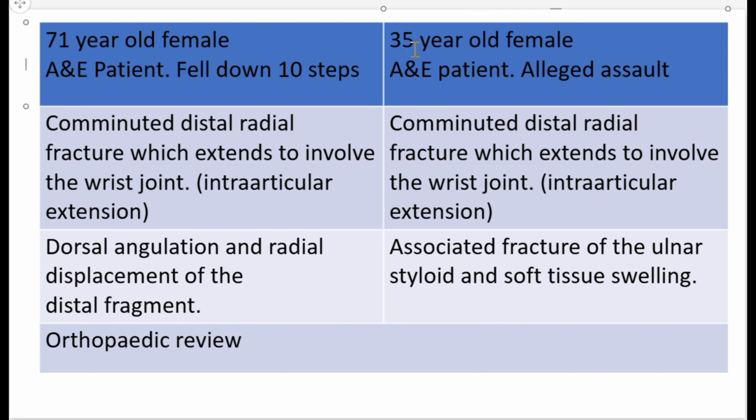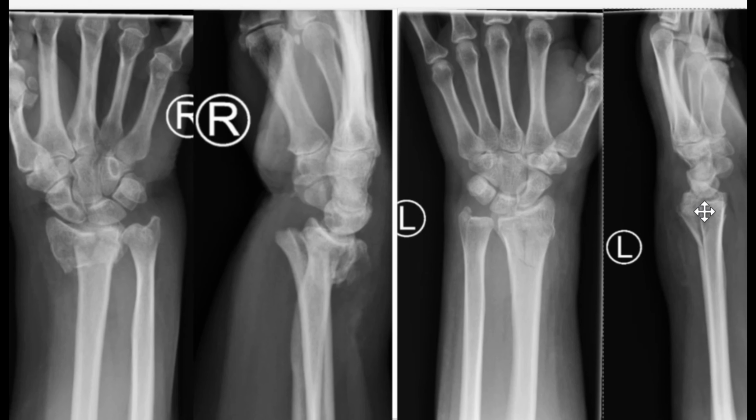A 35-year-old female A&E patient, alleged assault. Had a fight. This is a 35-year-old adult female with a history of alleged assault.